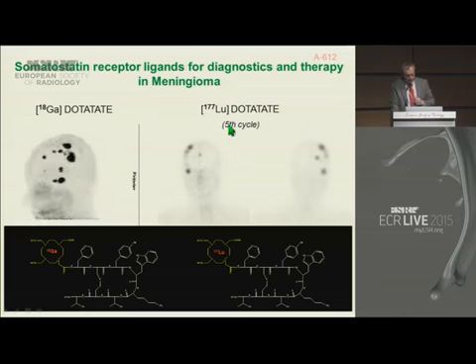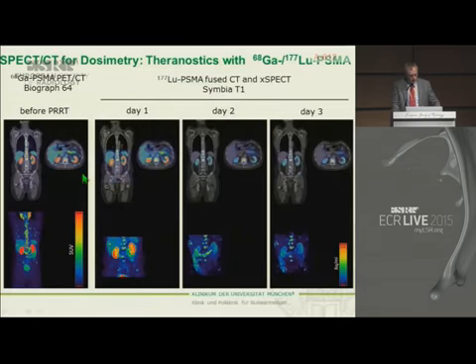So this is a patient we've treated with 5 cycles of this ligand. We use this usually for neuroendocrine tumors, but it also works well for meningiomas. But we need to do here accurate dosimetry, and here is where the next hybrid imaging, the SPECT-CT, comes into play, since we need to assess here the radiation burden of the kidney compared to the metastasis.